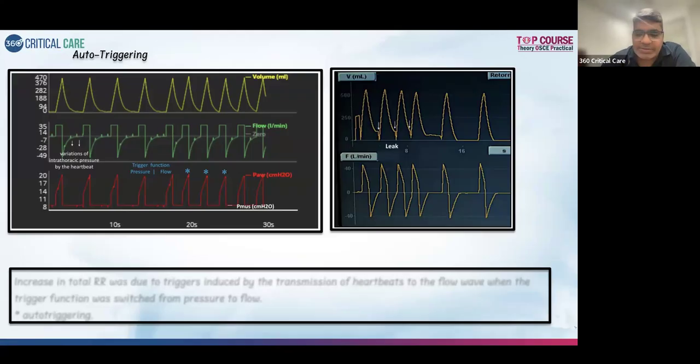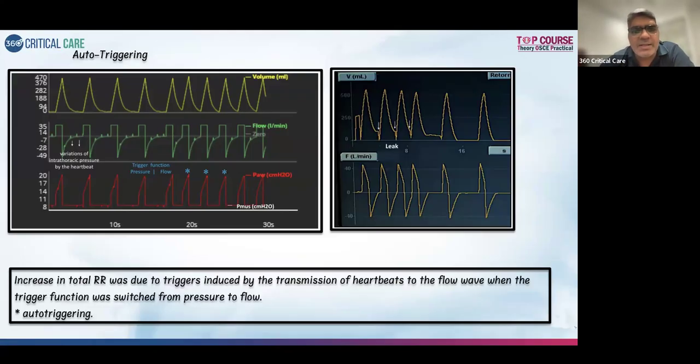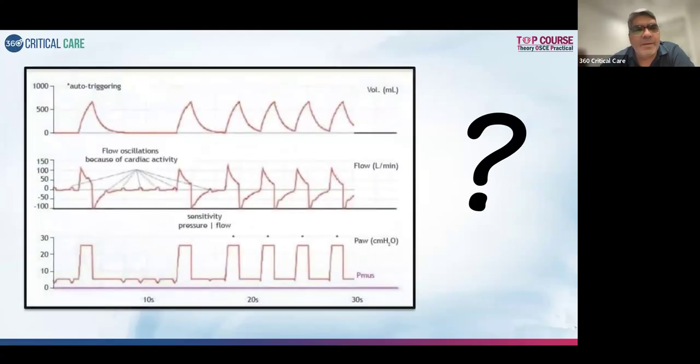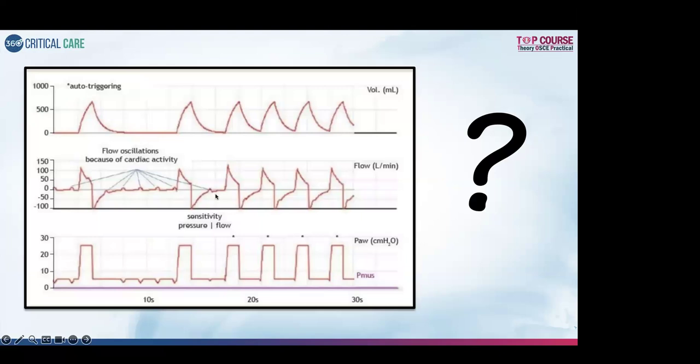The causes can be various. There are various causes to that. I'll go into detail about that. Just again, a similar type of picture where you can see it is getting auto triggered. Again, these are ineffective triggers from cardiac activity, but this one becomes effective and a breath is given. All right.